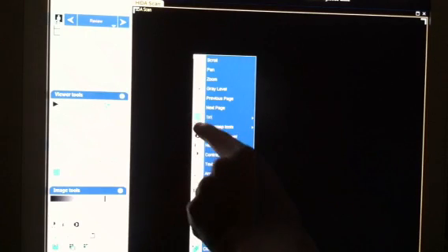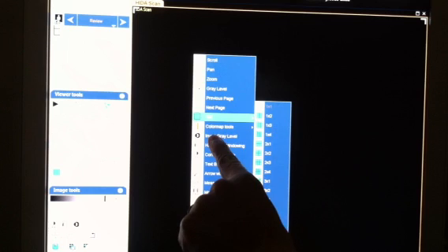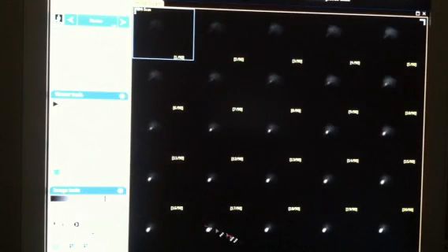Alright, the next thing I'm going to do is I'm going to right-click in the box here. It's going to bring this up. And we're going to come to this icon here. It says 1 by 1. But we're going to change it all the way down and do 5 by 5. There we go. It's bringing them up nice.